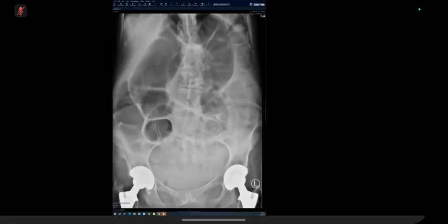So level of cecum. You think this dilated loop is cecum? Which one? This one, this big one. No. Or this one? This one may be the right colon. Okay. So if the right colon is dilated, would the obstruction be distal to the right colon or proximal?